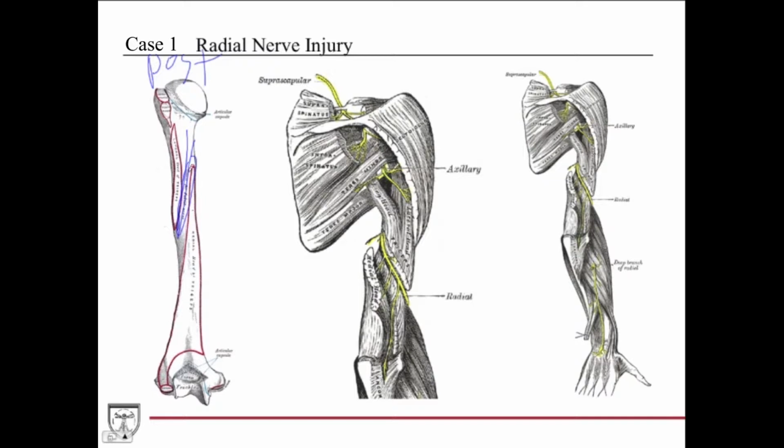So you have the radial nerve traveling very close to the humerus here, and you can see all the way here to the middle part, or the mid-shaft region. You can see that here as well. This is the same region as we're indicating here, and you can actually see that nerve traveling through that radial groove on the posterior aspect of the humerus.